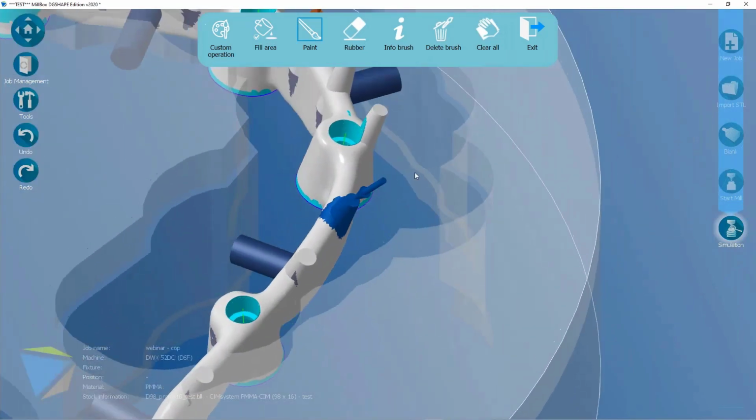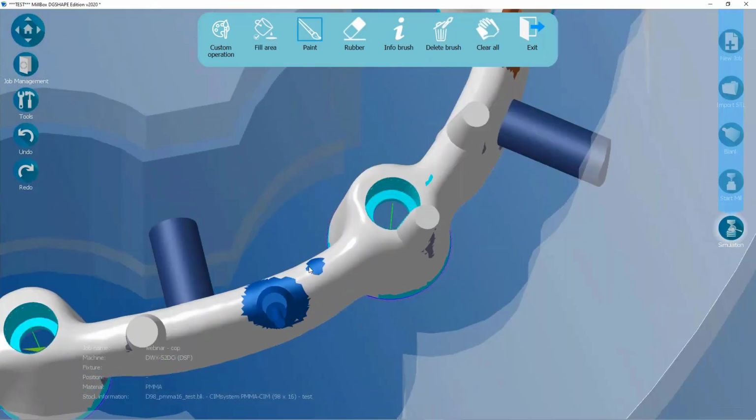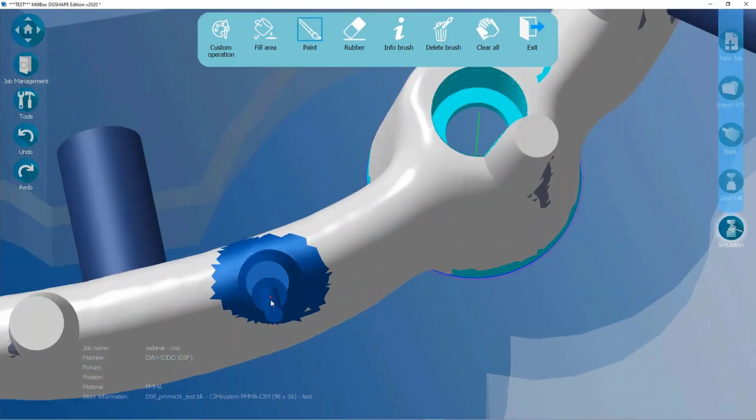You can make a collision between the cone, the extra part, the shank of the tool, and maybe the corner, and the edge of this part of the disc. Okay, and it's very easy. I'm still inside, so it means this time I can assign another angle, maybe better. Okay, maybe say no, it's too much. So let's try to change.